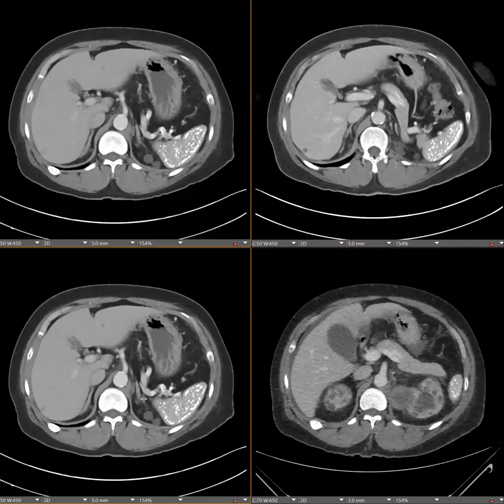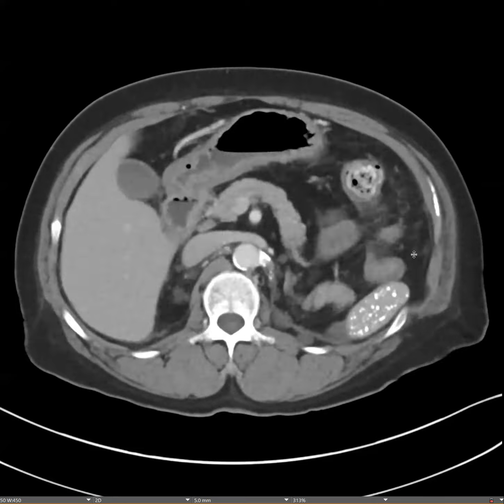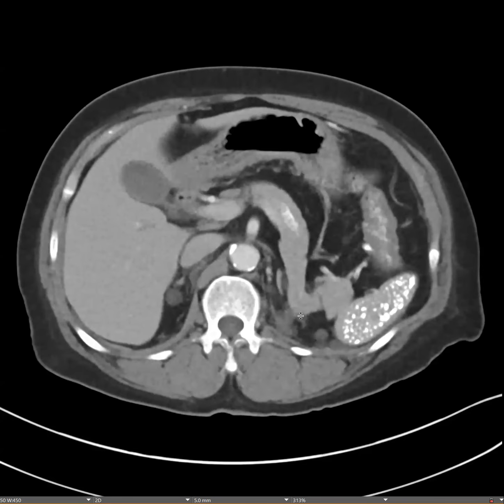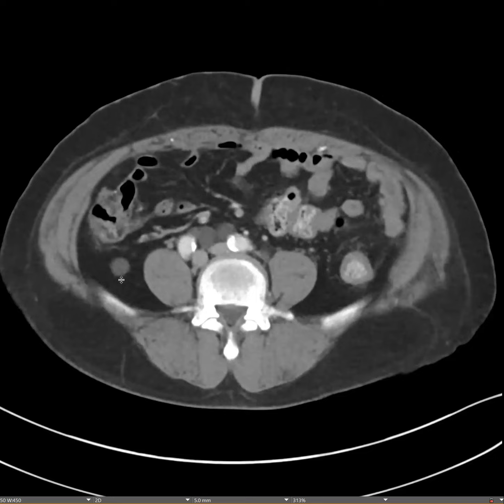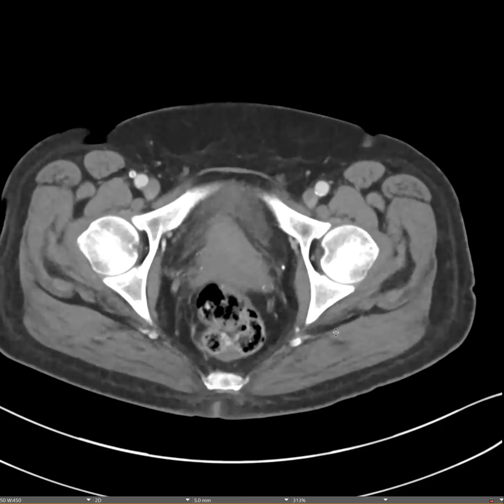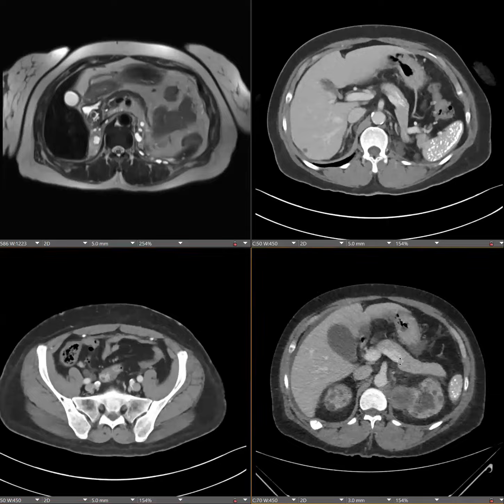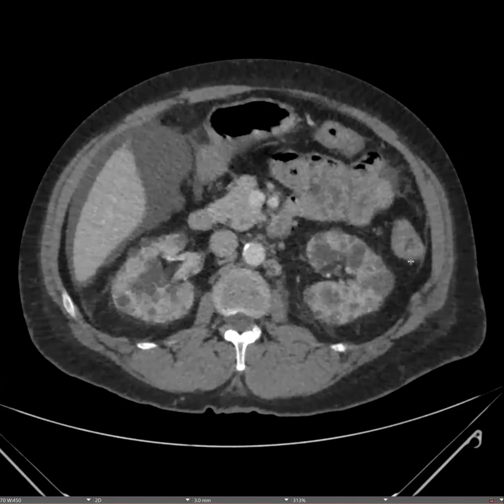And fast forwarding, he has been followed up over time, and he had a bilateral nephrectomy, and he has multiple hypodense lesions in the renal bed. Any thoughts? He has also in the retroperitoneum. And they only showed up post-op? They weren't there before? No, you can see here, his retroperitoneum did not have anything else.